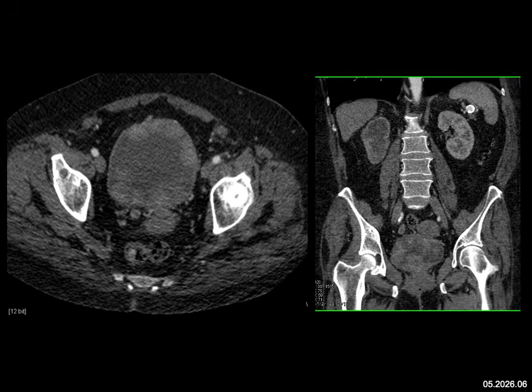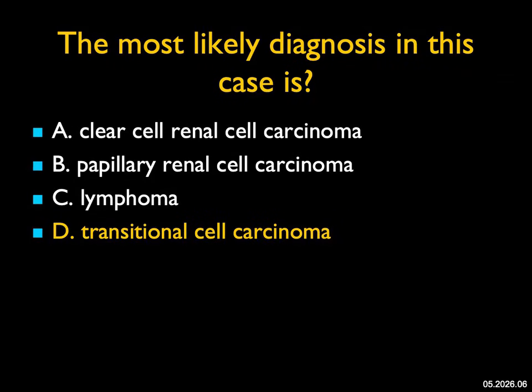Those both could explain in theory the renal mass, but not the bladder. Lymphoma gives bulky masses involving the kidney, and usually the bladder secondarily, not primarily. This is classic for multifocal transitional cell carcinoma, which is multifocal in greater than 40% of cases, and in this case arose in both the bladder and extended upward into the ureter and into the right kidney.